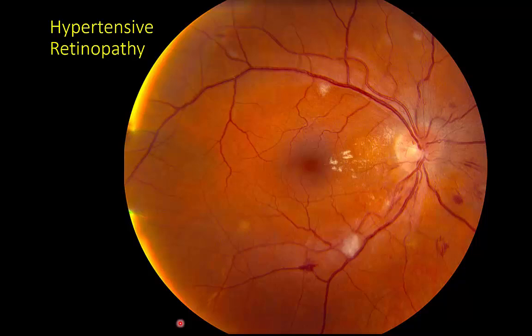So let's just look at this for a second. First, we noted that the disc here is certainly blurred on the superior margin, inferior margin, as well as the nasal margin. It's clearly better on the temporal margin. We can see that the disc head is elevated. Here's the vein running down then out. Here's a vein running down and out, so the disc head is actually elevated.